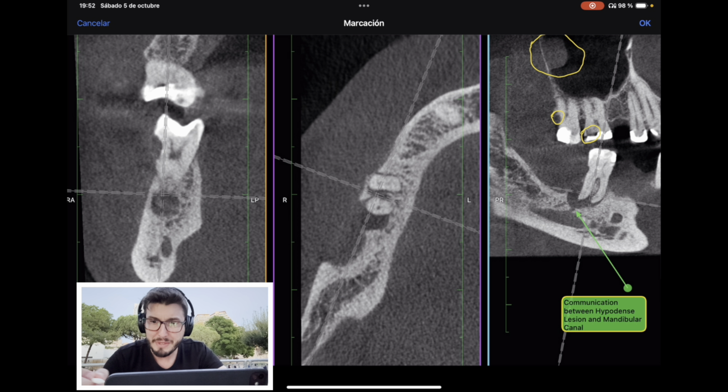Now we have, of course, the edentulous region. You might have a little bit of horizontal bone loss, so the level of the alveolar crest is slightly altered, but in this case that's still fine. With experience we know that this is still enough to place a dental implant. So what would you do? You would move your axis to the edentulous site completely, and then you would do your linear measurements and your implant planning, most likely using implant planning software. That's the ideal situation.